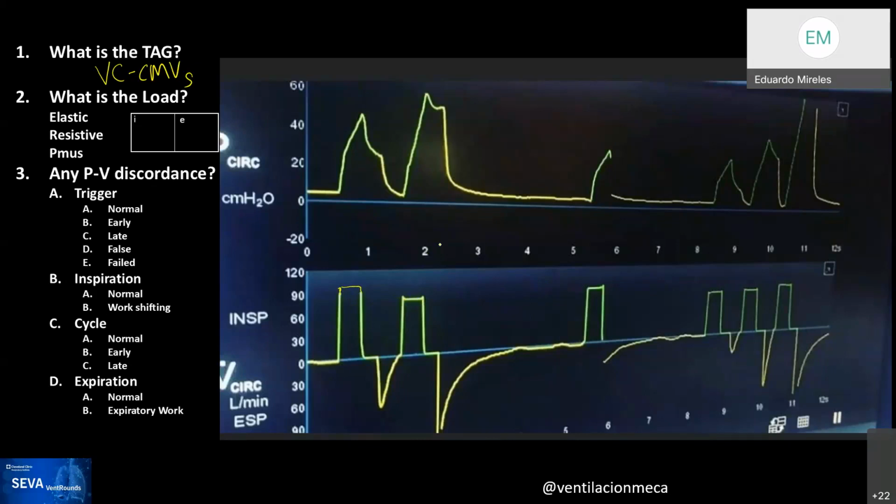But it could have been higher. I don't, but it's still, you can see the difference. So the flow is being controlled. I have no question about that.